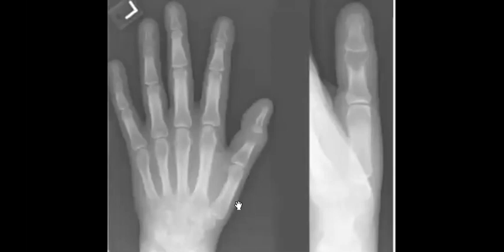Then you mention the site, and the most important thing to mention is that it has cortical breaching, a little expansile, so like a bit of an aggressive type, right? Search for any periosteal reaction or associated soft tissue, then you can confirm that it goes more with aggressive behavior versus non-aggressive behavior, right?